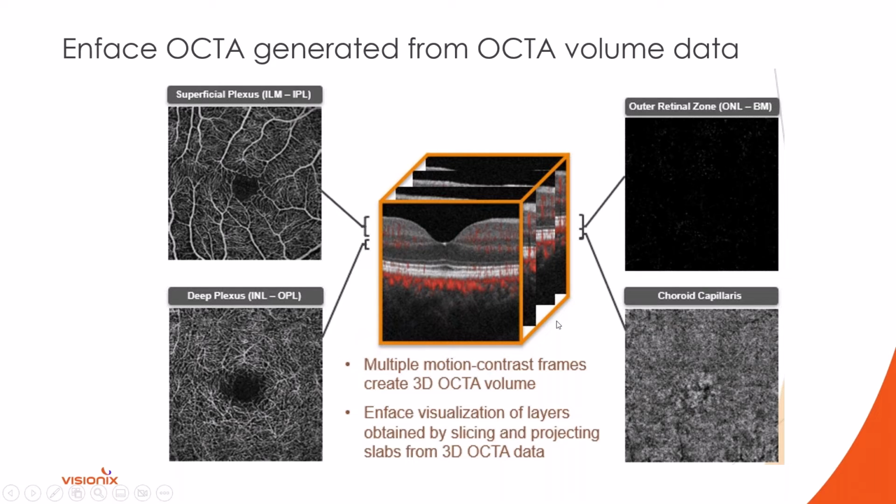You peel that away and you go one step deeper into the outer retina. This is in between the basement membrane of the RPE and the outer nuclear layer. Of note, there are no blood vessels in this area, so you should image this dark. There should be nothing there, which is what you're supposed to see in normal. We'll go over what normal is in just a second. Then you peel that away, and one step deeper, now you're into the choriocapillaris, which is a densely vascular sponge, and you can see that here. So layer by layer, that's the en-face imaging.